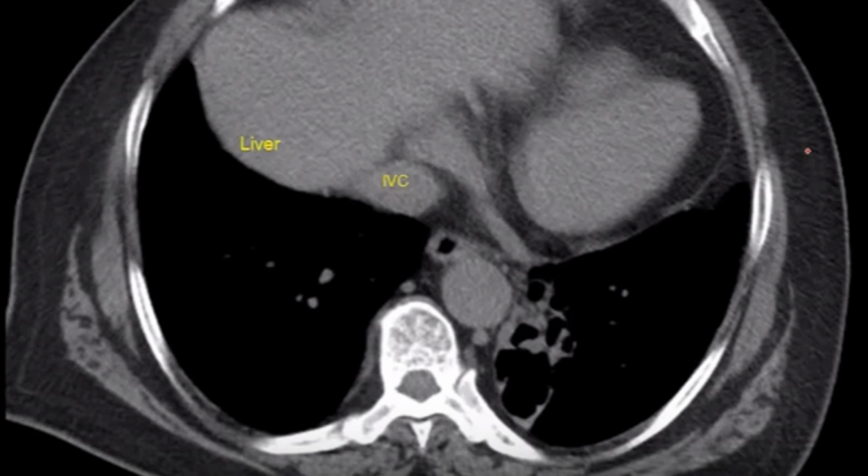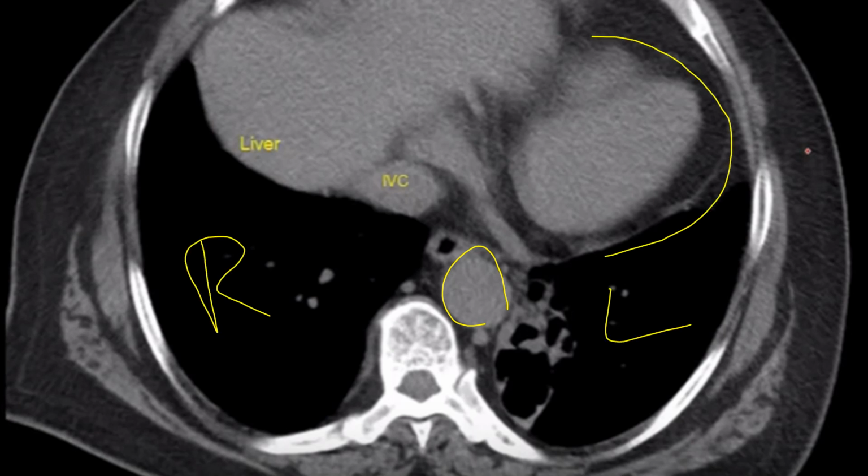when you're looking at just the straight black and white version of it. You're going to see the heart sort of disappearing. You see the descending aorta, and then you start to see the dome of the left side. Remember, this is the left lung, this is the right lung. The left diaphragm starts to appear, and here we already see the liver coming through. Our inferior vena cava is coming up through the thoracic cage. Remember, the inferior vena cava comes up on the right side. That's why it looks like it's right side oriented compared to the spine.